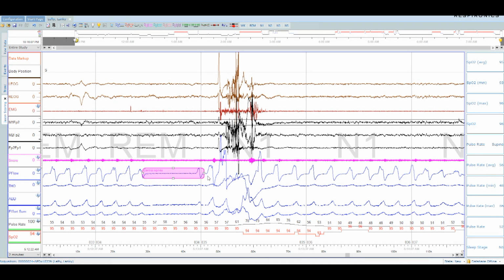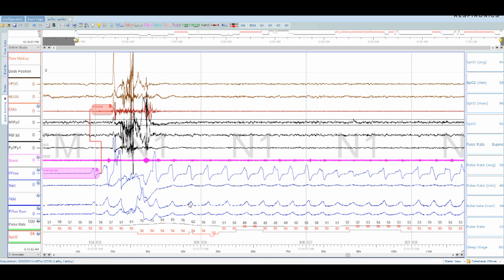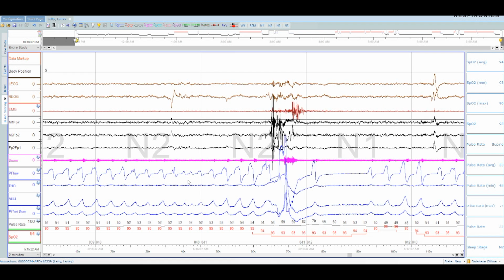It's a lot. So we have a central apnea. We do have an arousal right there. That's rare, folks. Very rare. See that breathing marker, guys? For those of you that had a PAP analysis with me, you know exactly what that is.